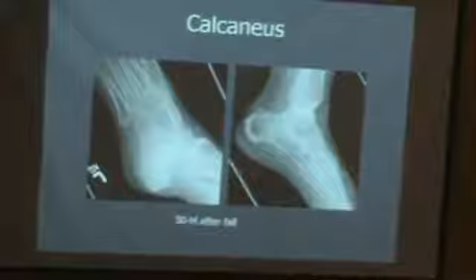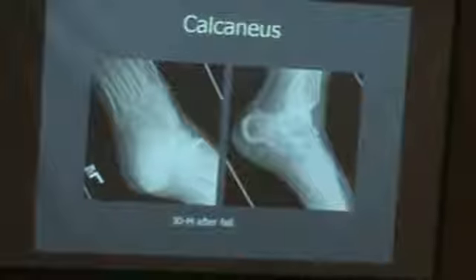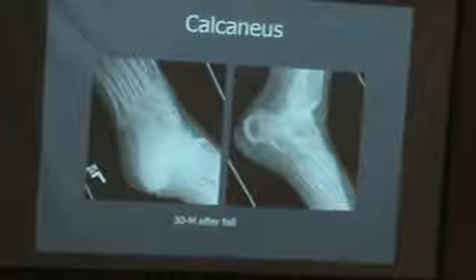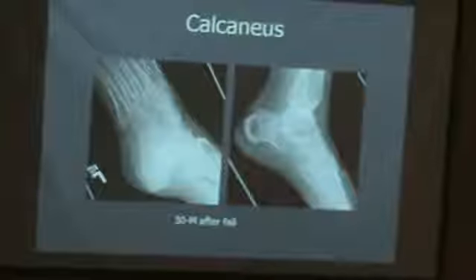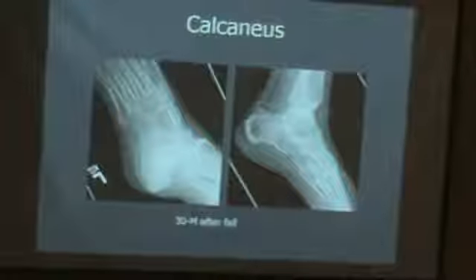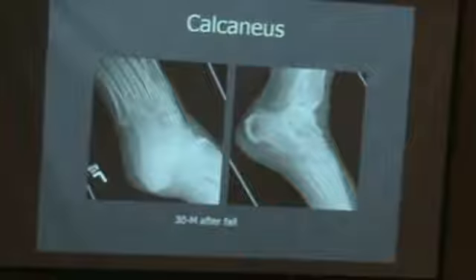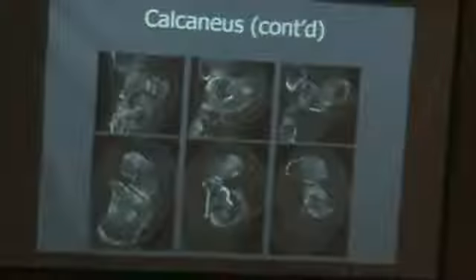That's your best bet. I'm going to finish with a few images very quickly. Calcaneus here, there is nothing. Even though the calcaneus, as I said, is usually easy, sometimes it can be misleading. The calcaneus here is completely normal on the X-ray, and look at the CT view here, you can see everything. You'll be very surprised when you see this.